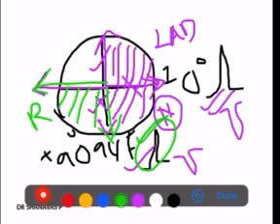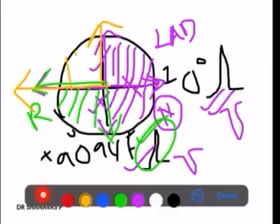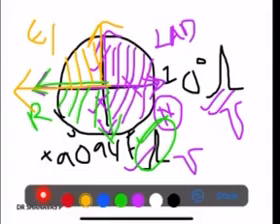Assume the last case where lead 1 is negative, that is this direction, and lead aVF is also negative, that is this direction, so the axis will lie here. From the previous picture we know that it is the extreme axis, the indeterminate axis. That is how the different axes come. I hope it is very clear. Coming to the discussion, it will be more clear.